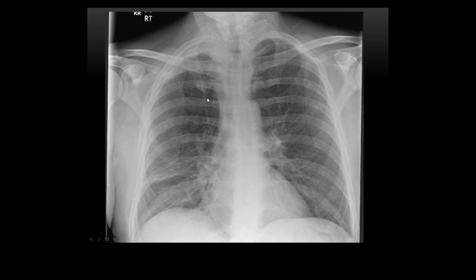Okay, what do you think of this one? Bit of a tricky one, this one.